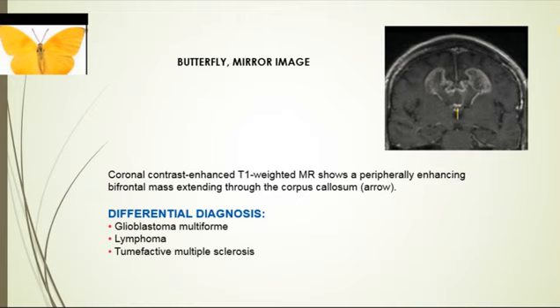The GBM, which is a high-grade glioma, demonstrates infiltrative margin, shaggy rim enhancement, internal hemorrhage, necrosis. The tumor behavior is aggressive, with frequent recurrence after surgery and chemoradiation. CNS lymphoma, the other possible differential diagnosis, generally demonstrates smoother margin, sometimes peripheral notching. Due to the tumor hypercellularity, the lesion will be on CT what? Hyperdense, because it's hypercellular, while on T2 will be iso to low.